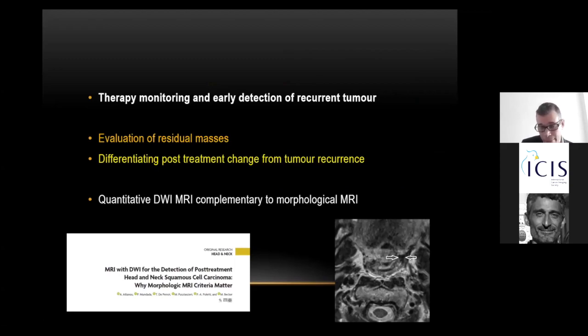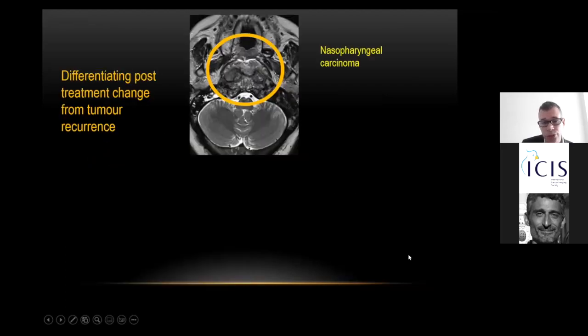First of all, there may be other benign mimics of recurrent tumor, such as abscess formation, which may result in restricted diffusion. But probably the most frequent problem is when we get an exuberant fibrotic response to treatment, which signifies successful treatment when we see these sort of stellate low T2 signal scars. However, fibrosis itself may correlate with restricted diffusion and decreased ADC. So we mustn't misinterpret this. And the only way we won't misinterpret it is by correlating with our structural imaging.